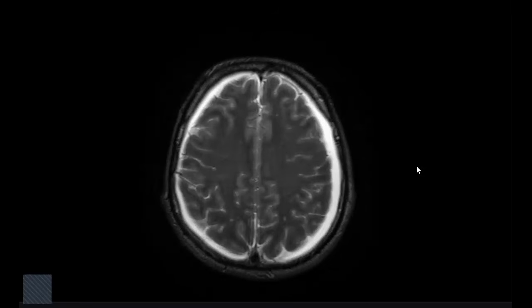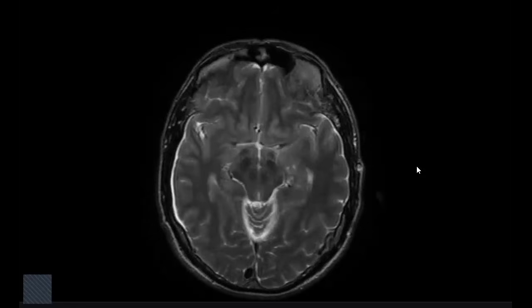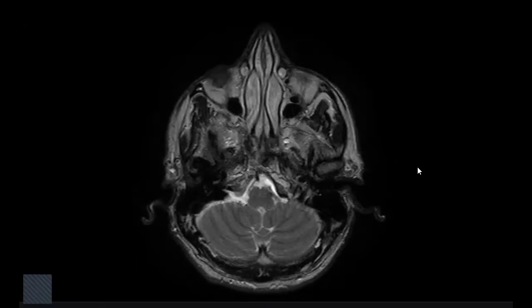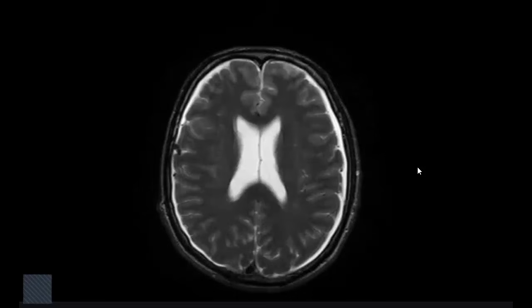I'm trying to see if there is any other abnormality. Both ventricles appear normal. There is no evidence of any other abnormality. The patient is coming with refractory headache, so I wanted to look for the post-contrast. Okay, what are you suspecting? As there are no constitutional symptoms or fever, this is not pus or empyema. I'm suspecting this could be a subdural hygroma, maybe associated with intracranial hypotension. So I wanted to look if there is any evidence of pachymeningeal enhancement.